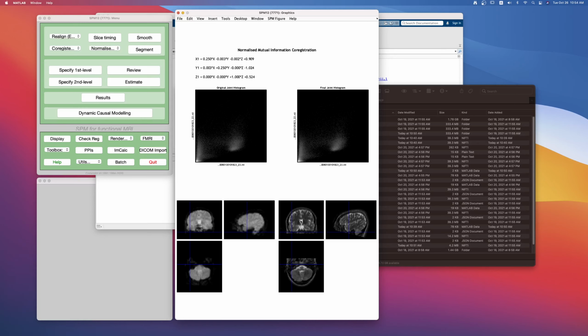And then I find it also helpful to check the ventricles, because that's not just the boundaries, but also the internal structure, to make sure that things are well behaved. So you can see that these are the ventricles, the edge of them, the horns. Okay, then you can check that they're being matched well. Another structure that would be very useful is the Corpus Callosum.